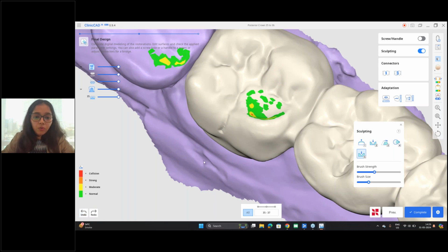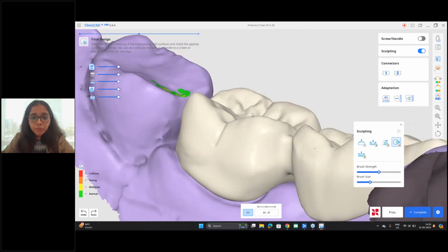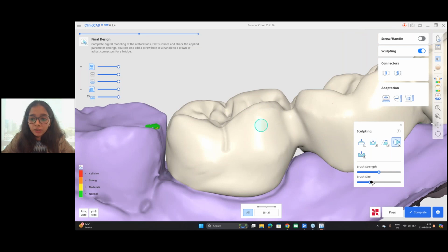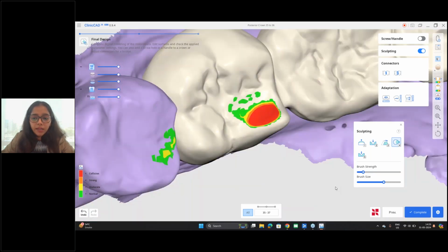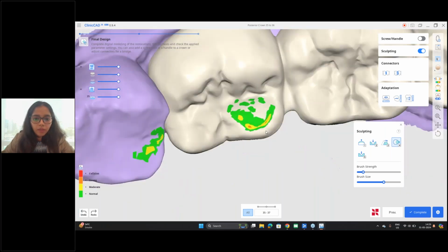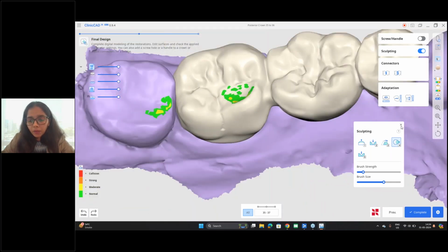Click on undo. Okay. And another good feature that I like is morphing. Now, for example, if you want to reduce the whole shape, not to smoothen it out or add something, but just reduce, then you can just pull the whole shape down or pull the whole shape up. That's the use of the morphing tool. It is the fourth tool. Okay. So this is my sculpting.